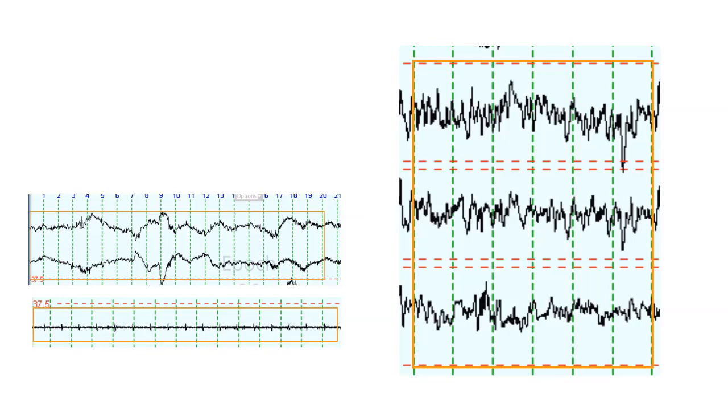Now, coming over here, I have a blown up view of our EEG, and I'm going to count in our occipital lobe, and I'm going to start with this first second here, and I'll try to mark each wave as I count it. So here's 1, here's 2, here's 3, here's 4, and here's 5. And remember, theta waves are 4 to 7, so this first second here meets that criteria.